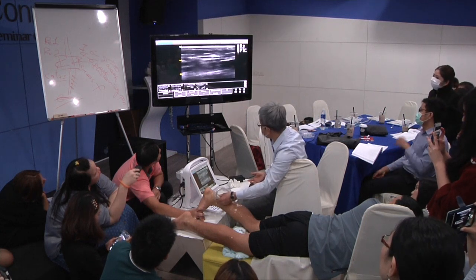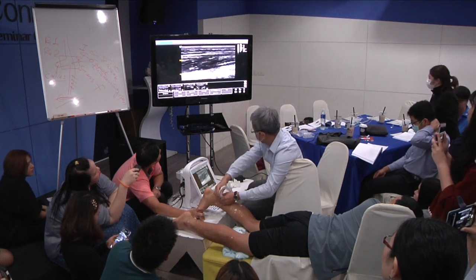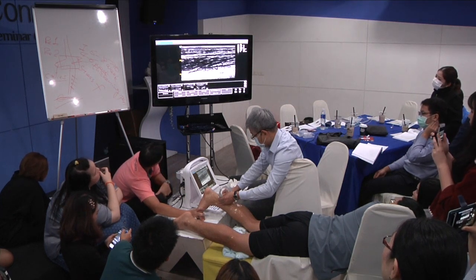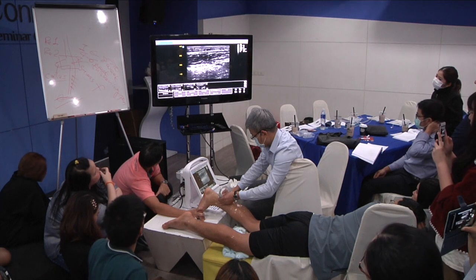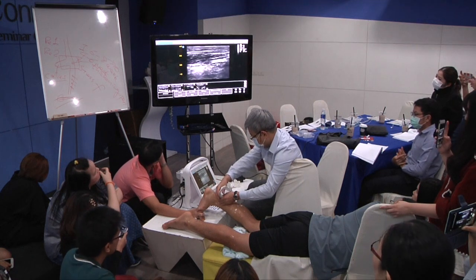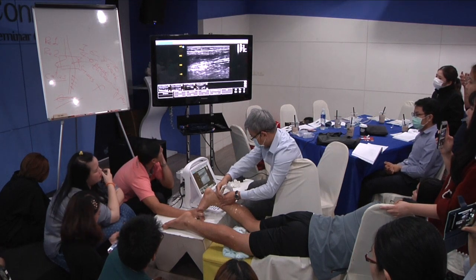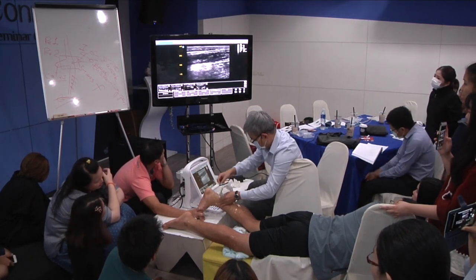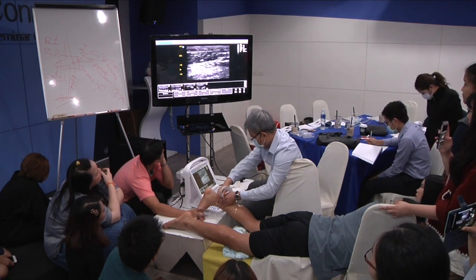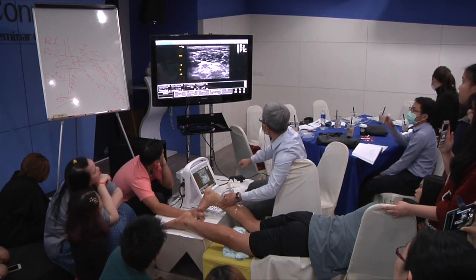So if you follow it, you find a very bright spot in here.